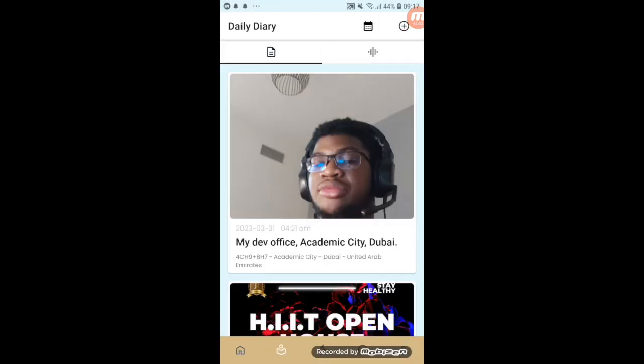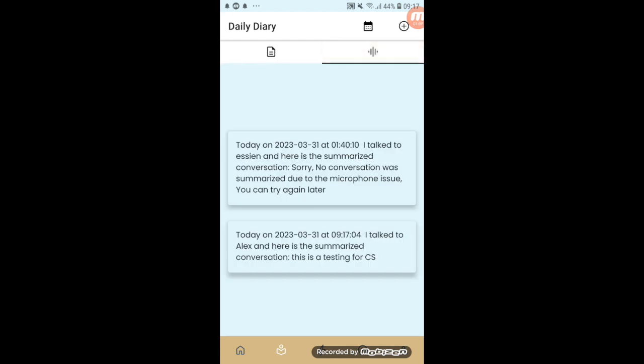So you can see here you got a message of saved successfully, and as you can see here, the last message, which is at 9:17 a.m., is the message written as I talked to Alex, and here is a summarized conversation. This is a testing for CS. So you can see here how this got summarized properly. So this is an example of how the conversations get summarized.